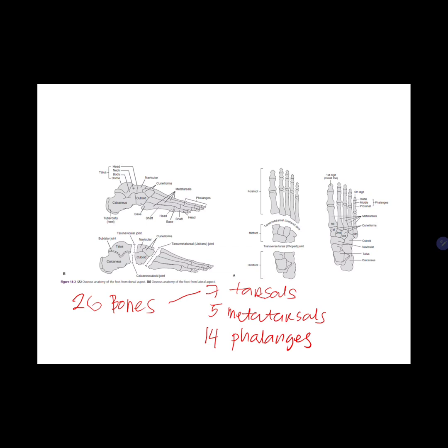The superior surface of the body is referred to as talar dome, and the talar neck lies anterior to the body. The talar head articulates with the navicular anteriorly and the calcaneus inferiorly. The posterior articulation between the talus and the calcaneus is the subtalar joint, and the anterior articulation between the talus and the calcaneus is part of the talocalcaneonavicular joint, the complex articulation, surrounded by one capsule between the talus, navicular, and upper surface of the plantar calcaneonavicular ligament.